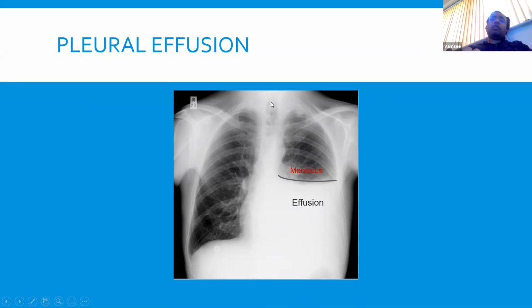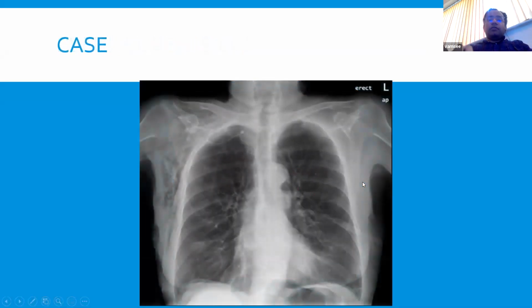If you have a whiteout of the lung, you probably see it more prominently because the trachea will be deviated, because it involves the upper zones rather than the lower zones. Fine. Now, in this case, there are two things that I want people to catch. I'll give you guys 15 or so seconds. And then we can do that.